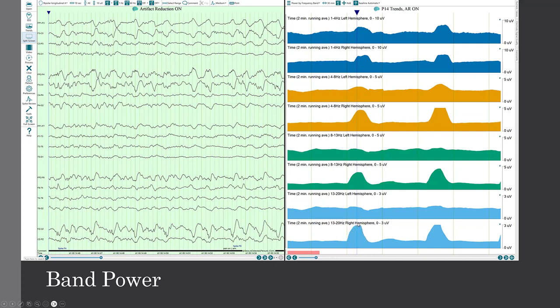Again, it's averaged over 2 minutes, so it's still up there, but it'll begin to fall pretty rapidly with the offset in that seizure. And the theta and delta graphs are picking up at this point. So you can see that there's something that's changing over time where we do have an evolving pattern where we have higher power in the faster frequencies that gradually moves slower. But you can see with the resolution and the separation of frequencies using band power, we're going to assemble those into a spectrogram and get a little better view of what's happening with respect to this evolving rhythmic pattern.